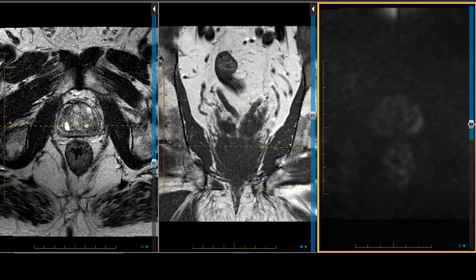This patient had a negative biopsy 2 years prior to this study, and the PSA wasn't really elevated. It was hovering around 2.4. But yet the clinician felt something on physical examination, and this is the perfect patient to have an MR. You know, the clinical exam's positive, the PSA non-contributory, and the patient is 81 years of age. Patient also had a family history.